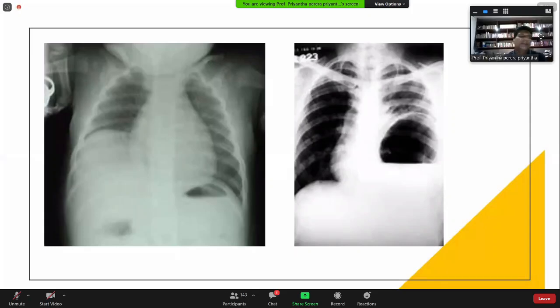It can happen during delivery, with big trauma. Stretching of the brachial plexus can damage the phrenic nerve, right? That can cause unilateral paralysis, resulting in paradoxical movements. Yeah, one diaphragm goes down, another one goes up, like that. So movement up and down like that. But commonly it is eventration of the diaphragm, right?